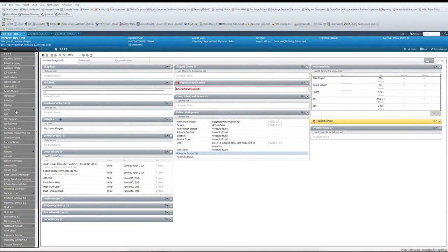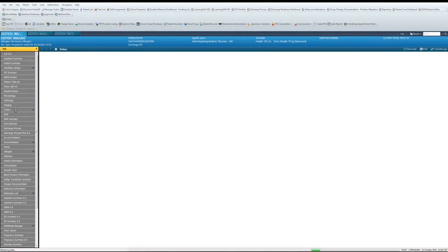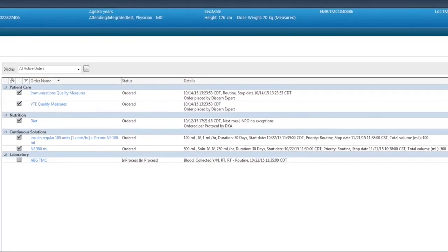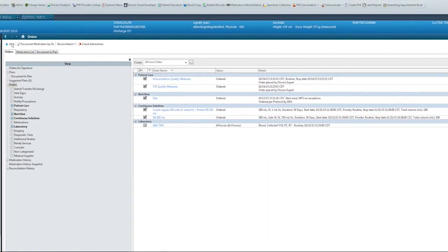Let us demonstrate the functionality of the diabetic ketoacidosis order. We have a patient who presented to the ED with a glucose of 550, and he is a known diabetic. The ED provider has started the patient on normal saline, intravenous fluid, and an insulin infusion. Subsequently, labs were sent and the patient was confirmed to have DKA.